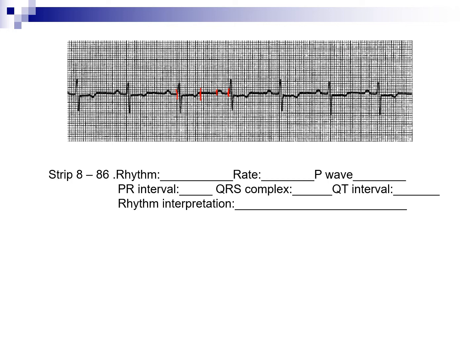You would basically call this a sinus rhythm, or sinus Brady if it's below 60, but it is a first degree AV block, and the ST depression and T wave inversions would be something you would want to note. Check your patient, make sure that they're not having chest pain with this, because T wave inversion and ST depression could be a sign that they may be having an inferior wall MI, so a 12 lead EKG would be warranted.